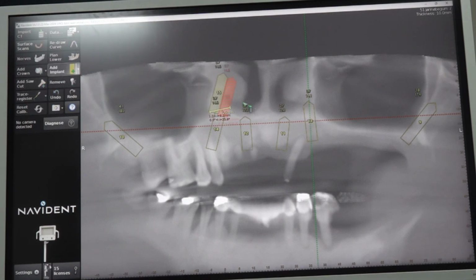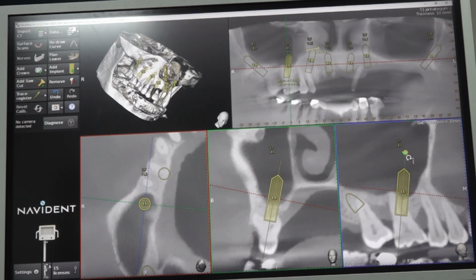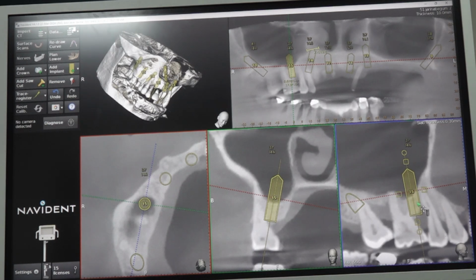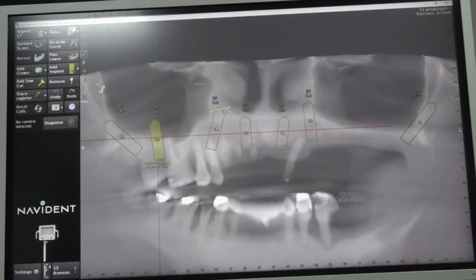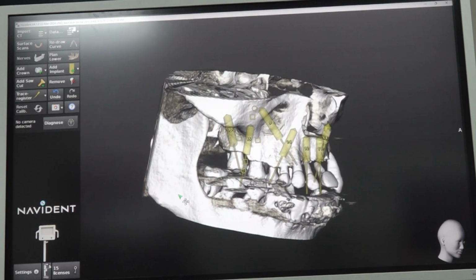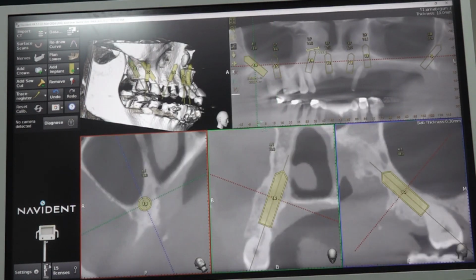You just check the 6 area. You will see. Sort of curiosity. No, it's not very good. Actually, this is 6. This is 7 or 8. We don't know. Maybe the 7 was extracted long back. The 8 has moved forward. Okay. So we replan the 8.